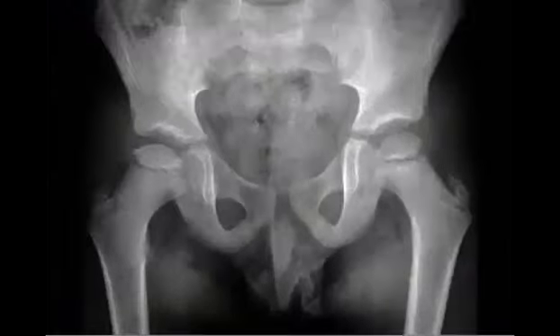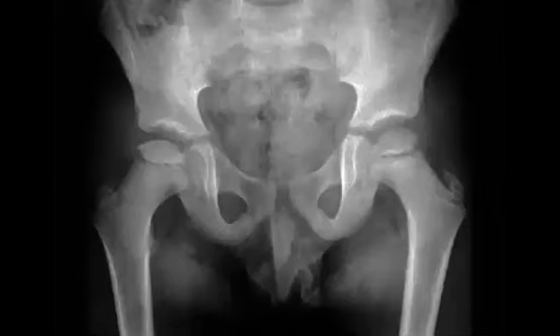Again and again, when you see the pelvis of a pediatric patient, you have a limited differential diagnosis of 3 or 4. So try to go quickly. Search for any widening in the joints, because this one will be septic arthritis. And if not, then go for the other 3.